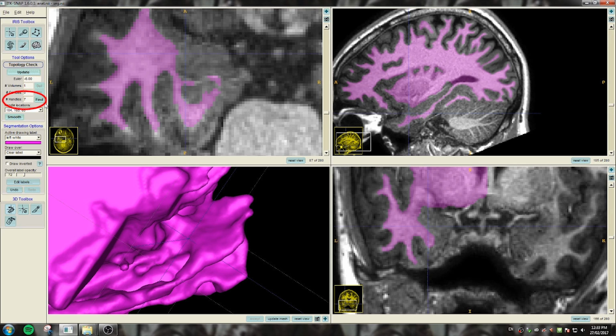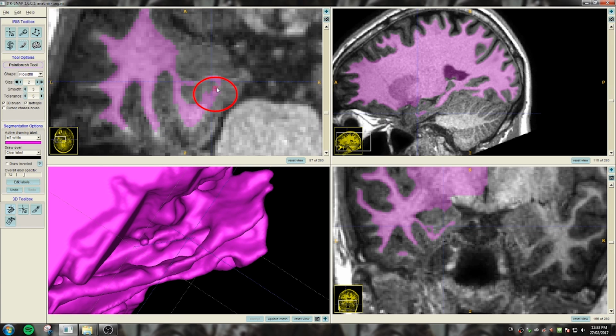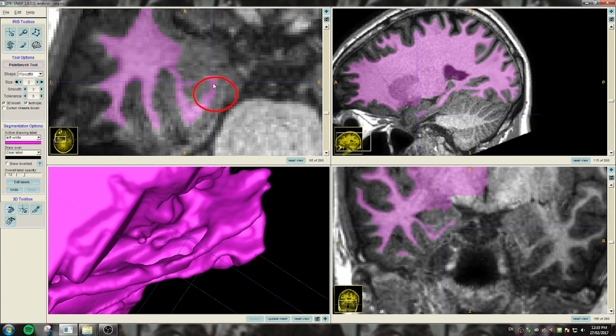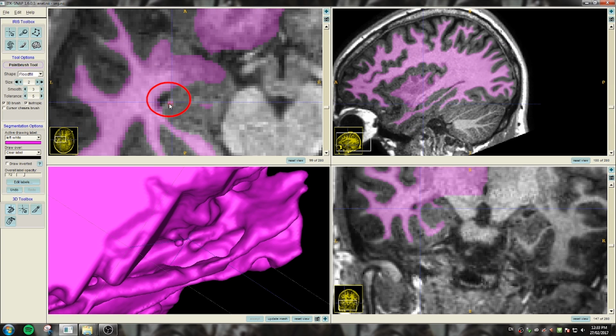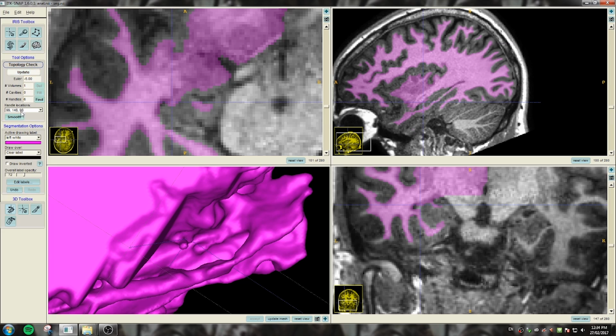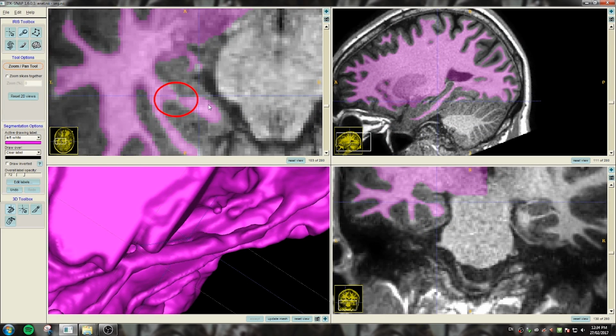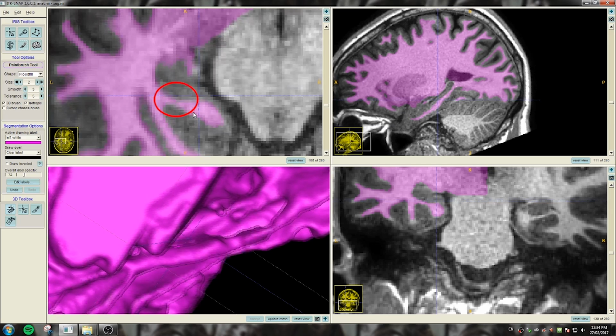What you have to do is go to the next handle by going to the drop down menu and changing the coordinate and then filling in the gap. I'm just quickly showing you some examples of handles that are present in this segmentation. I won't go into too much detail as to how I filled them in. It's essentially the same as the example I showed you, where you'll see a gap and you just have to fill it in using the paintbrush tool.